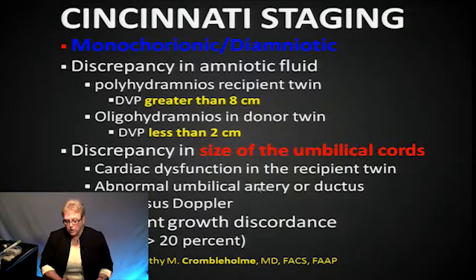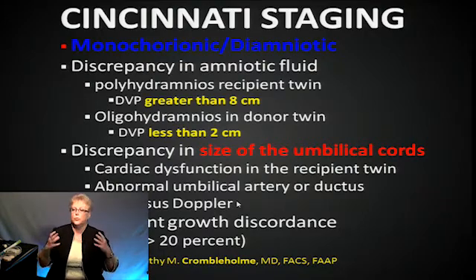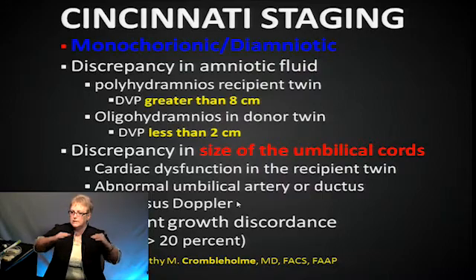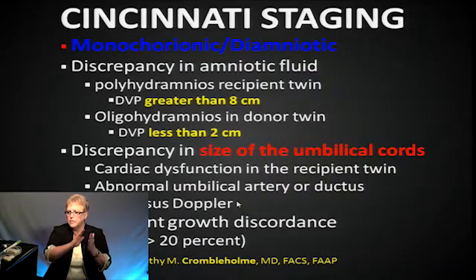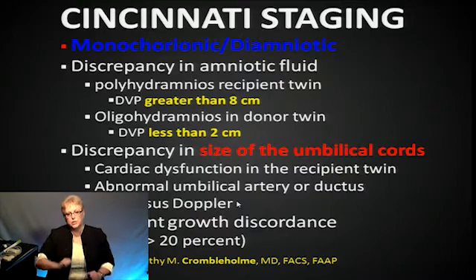One of the things that I've learned since I've been at Texas Children's Hospital is even when you see this and you know that it's going to end up having to have the surgery done, they're waiting until there's enough fluid in there so it's actually thinning the placental mass out, because they want it as thin as possible. They're looking at the surface vessels on the placenta and they're going to ablate them. So they want to have that polyhydramnios in there.